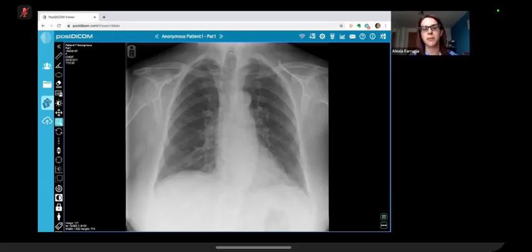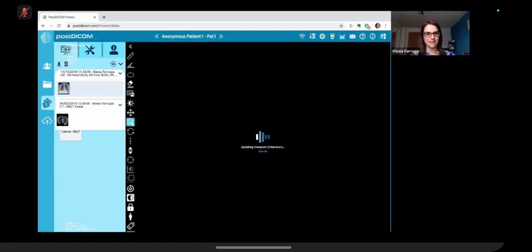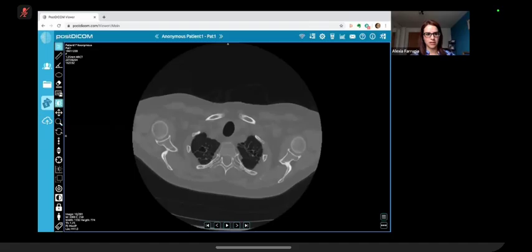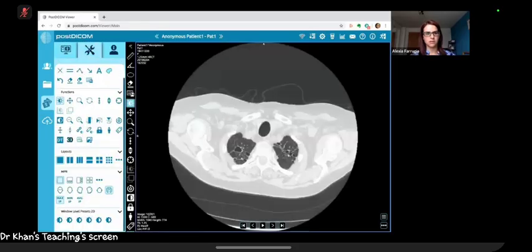What would you do as your next step? What would you recommend? In a patient in whom they are already querying ILD, I might recommend a CT chest, possibly without contrast, maybe a HRCT. That's correct. Yes, that's what we did. We did an HRCT for this lady. So I'm going to scroll through. I'll just change the window slightly. I'll change it to a lung window. For some reason it's stuck on a bone window.